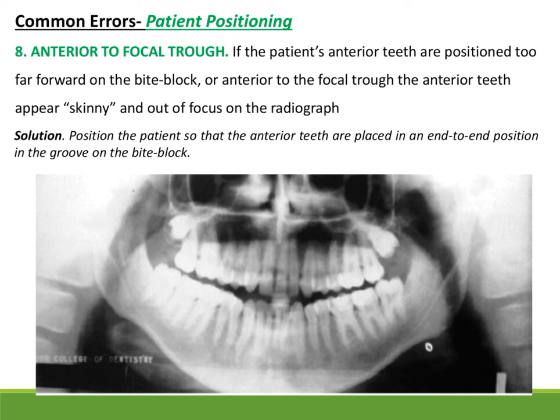But if you are making the patient bite beyond the notch in the bite block, that means a major portion of the bite block is inside the patient's oral cavity, then the structures can appear thinner and definitely out of focus as well.